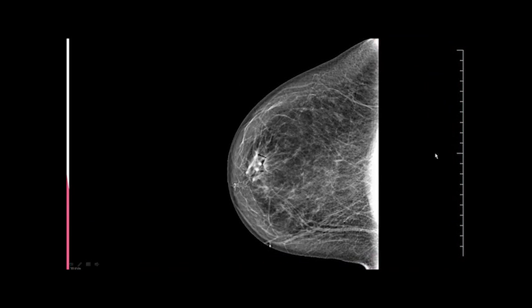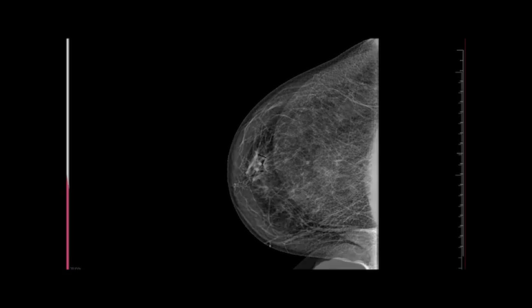Here's a pretty image. Medial tissue, muscle. This patient's very fatty, but you can see here, the nipple's not in profile. It's folded under. There's a BB. That's how we know. If you didn't have the nipple marker on there, you wouldn't even know where the nipple is. There's a little air gap from the tape because the nipple is so folded under. So if you're doing patients like this daily, that's fine. Just do a nipple in profile view. But for accreditation, no. You don't want to send an image in when the nipple's not in profile.